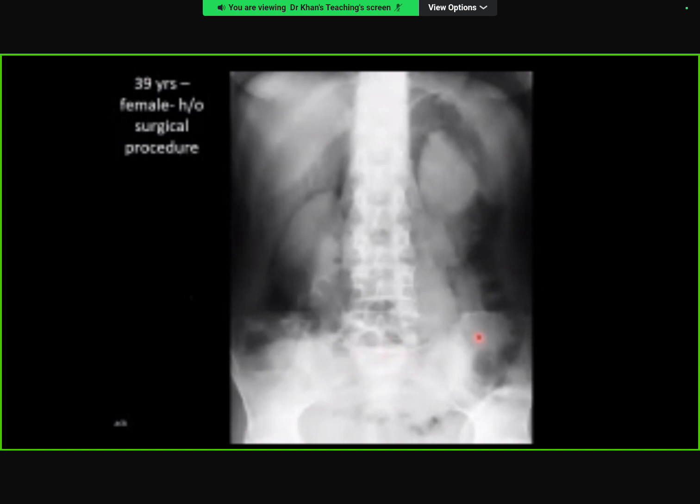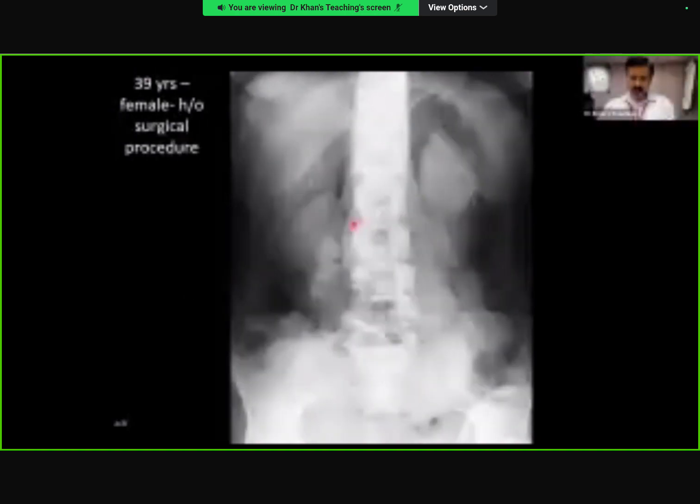Okay. Yeah. If you see here, let me take over. Now, this is a very good film to develop your eyes on where the retroperitoneum can be. So, of course, it is outlining the kidney, outlining the psoas, right? But another thing you have to remember is this is the hemidiaphragm. The posterior, posteromedial portion of the diaphragm is touching the retroperitoneum. Another sign, now if in your exam you pick it up as a retroperitoneal gas, of course you are passed, but you want to get more and more marks, and the finer touch is that you have to pick up the finding.